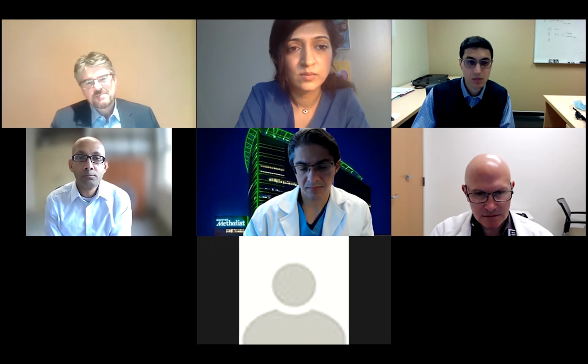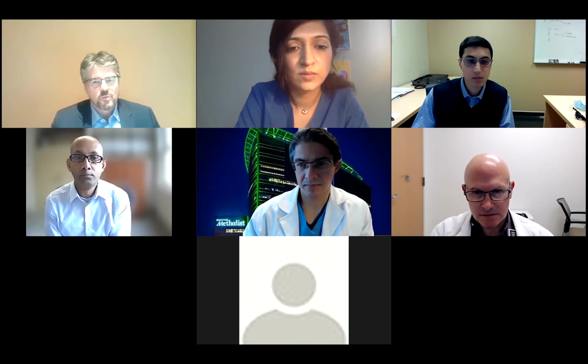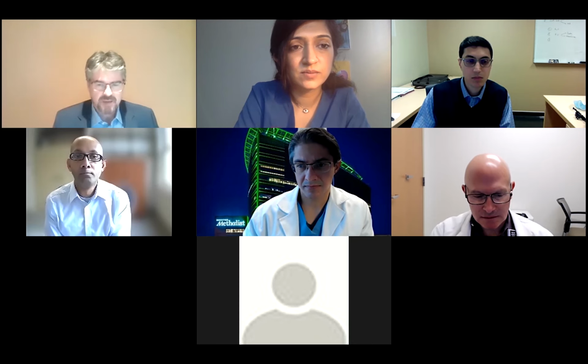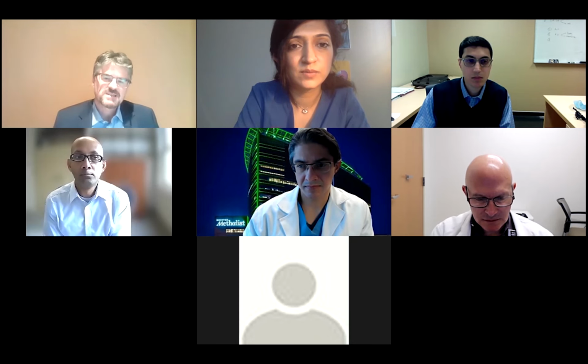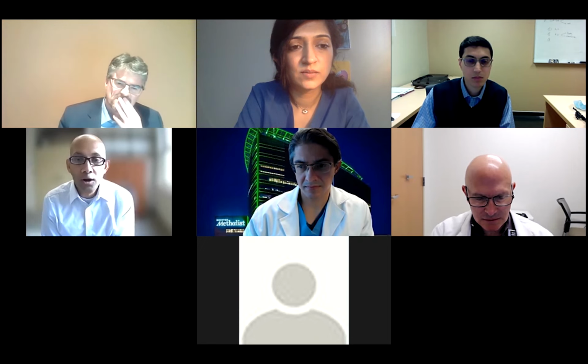Which brings me back to the point which we had discussed, balanced ischemia versus triple vessel disease. And maybe from all three presenters, how do you deal with balanced ischemia? Is there such a thing as balanced ischemia? How do you deal with severe perfusion defects? How do you go about those cases?